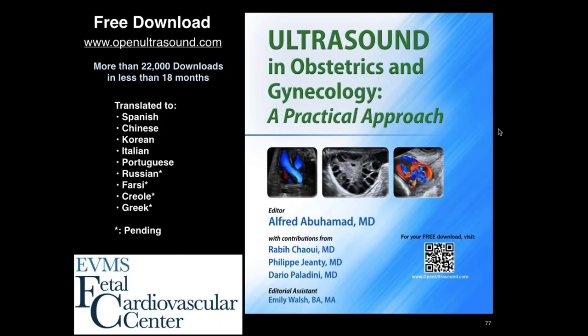Two, there's increased distance from the spine to the posterior wall of the left atrium in cases of total anomalous venous return, more so than you see in the normal situation. And 3, if you get into the habit of putting pulse Doppler on the pulmonary veins, in total anomalous venous return, many times there's venous obstruction, and the Doppler tracing can be very telling in those situations. These are the 3 things that I would recommend to look at.